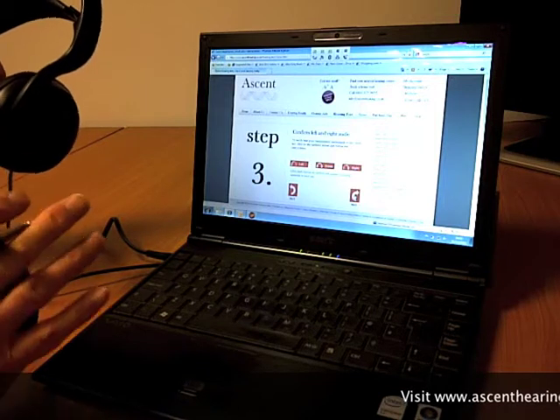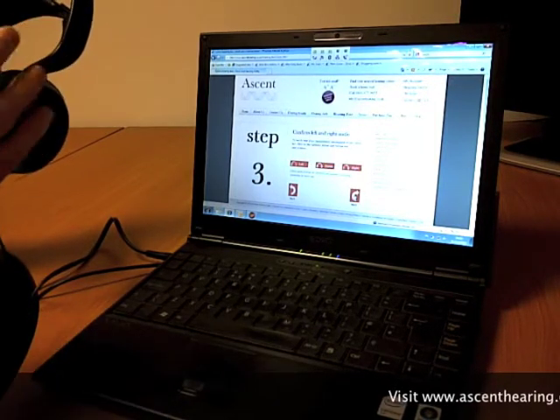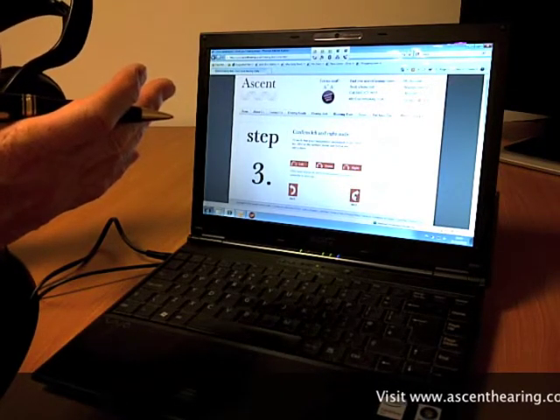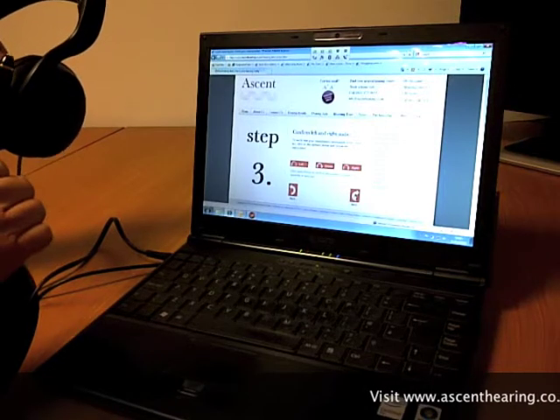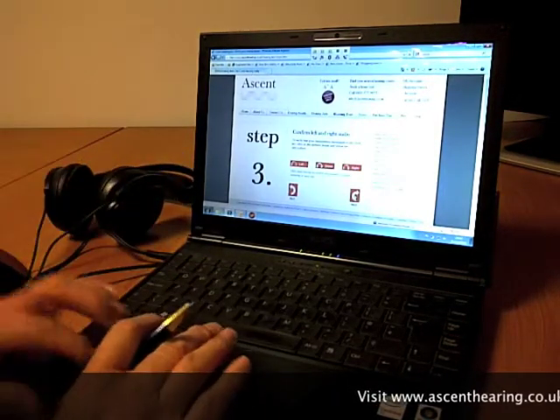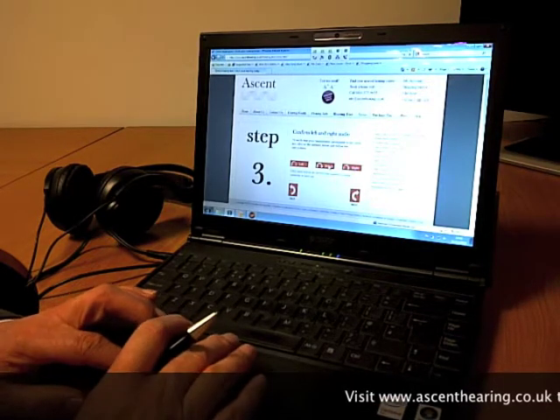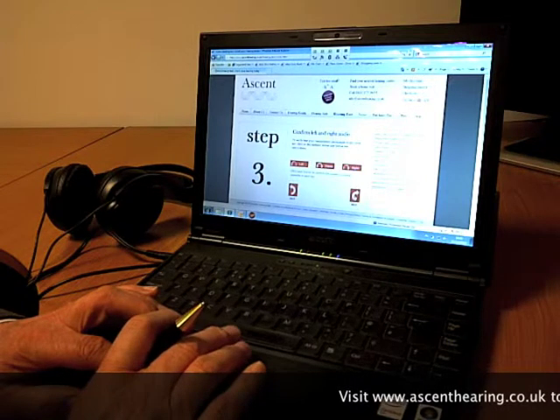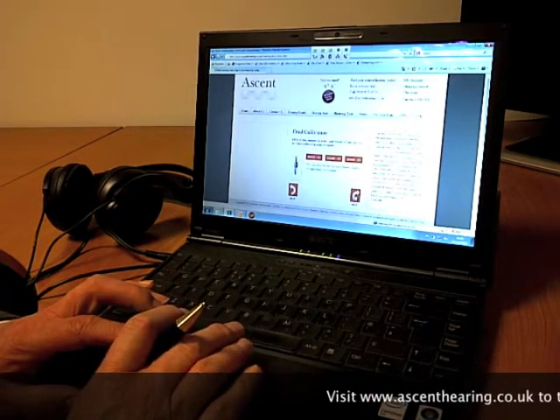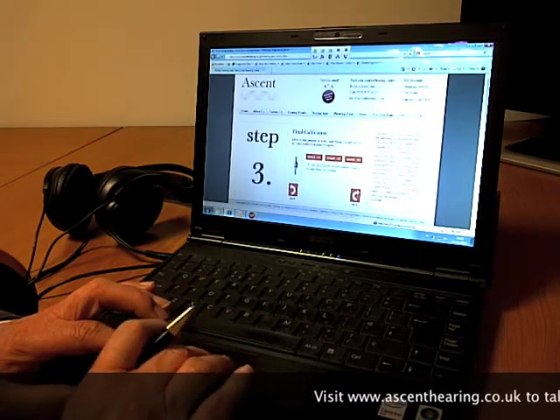And that just confirms that the headphones are working properly. Because obviously, if one of the headphones is broken, you're going to have a difficult problem hearing signals. So it's simply a matter of checking before you start. And again, this is 2 seconds of a job. So listen to my left, listen to the right, listen in stereo, and then once I'm happy with that, I move on.